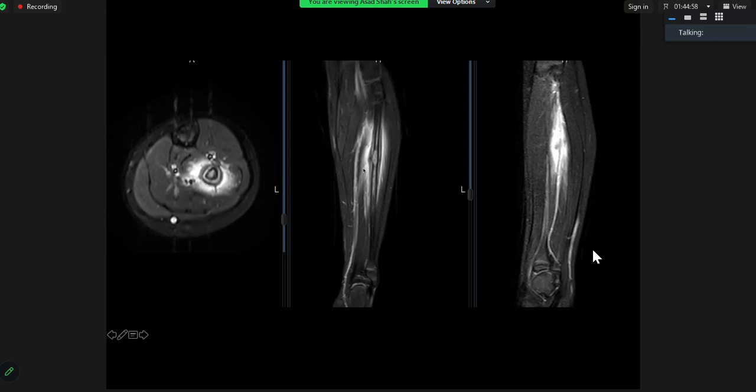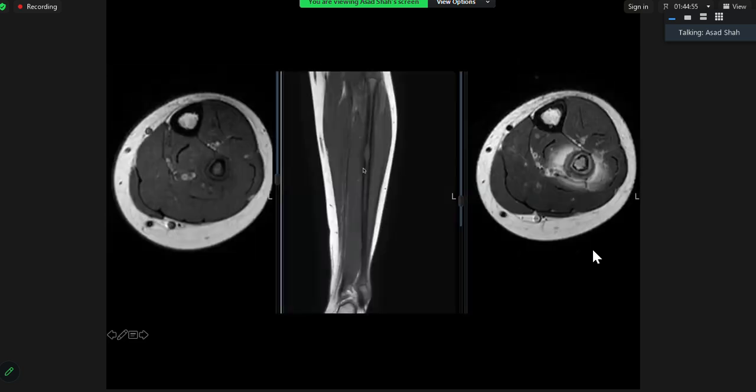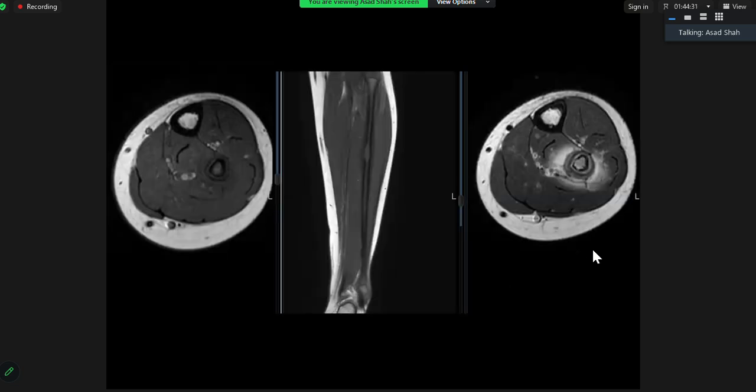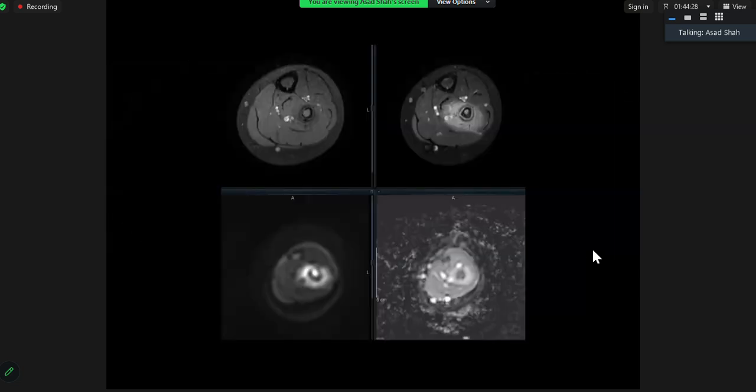The child was well, but obviously, infection. You can have low grade infection, or you can have tumor. So whenever the tumor and infection, they always interplay. On imaging, sometimes if you see a large extraosseous soft tissue mass, then you think it's tumor. If you see abscesses or the child is unwell with fever and things like that, then you think about infection. But when you are in doubt, you always have to do biopsy. So yeah, it was biopsied. It came back as LCH. All right. Okay, let's just move on.